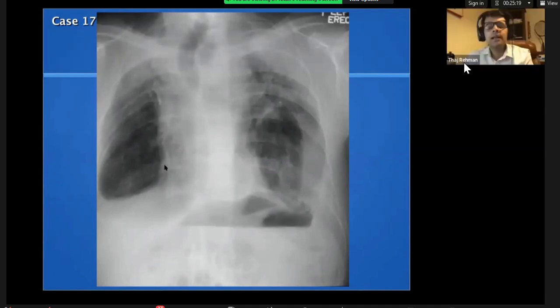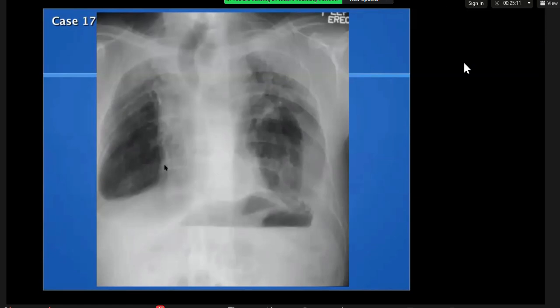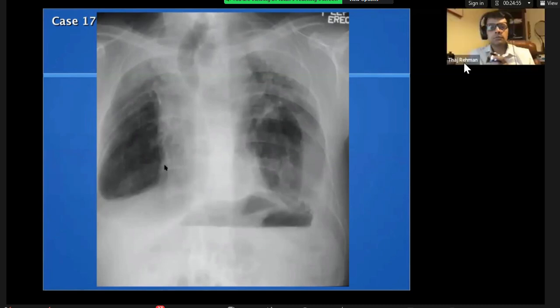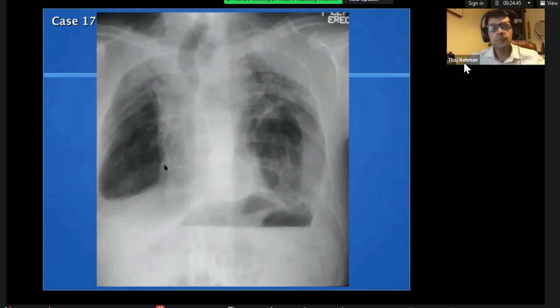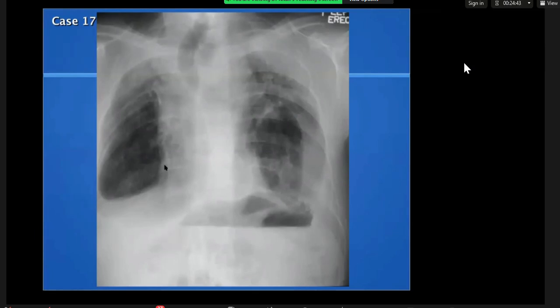Can you hear me, number 6? Very good. This is your X-ray, number 17. Sure. So this is a frontal chest X-ray of an adult patient, which demonstrates deviation of the trachea to the right side, and there is blunting of the bilateral costophrenic angles. Looking specifically at the left upper zone, I can see opacity around there causing potential mass effect to the contralateral side. There's this opacity tracking from the upper to lower zone in the left lung.